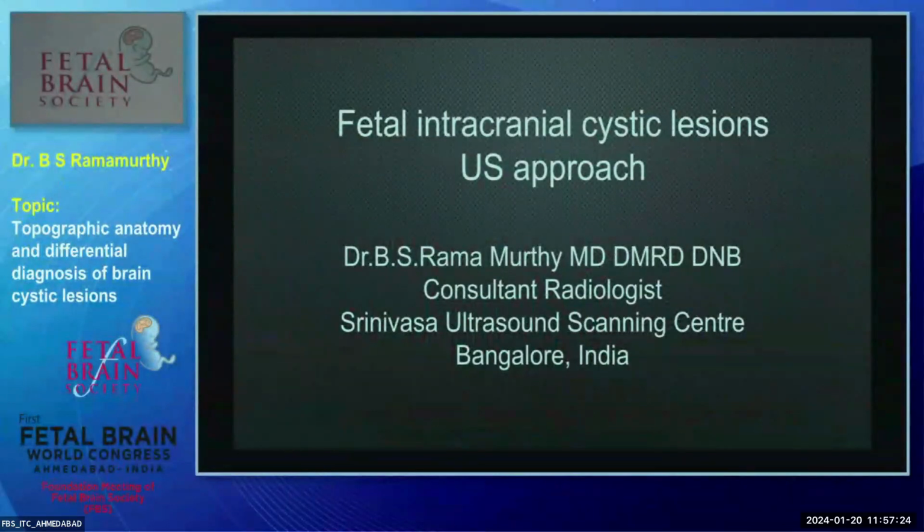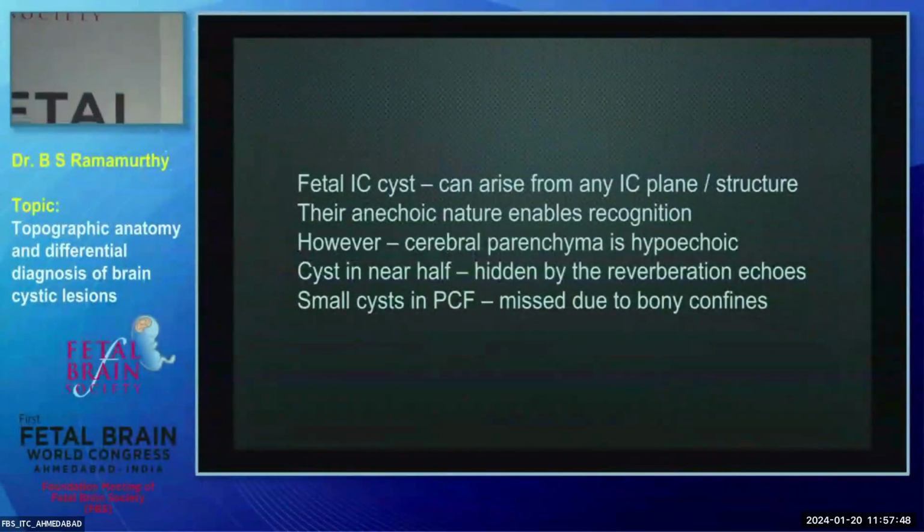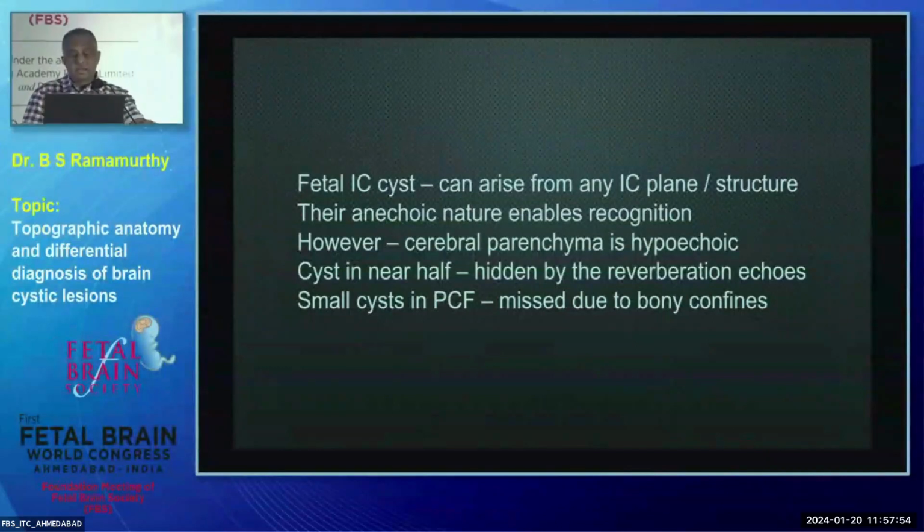Very good morning. In 20 minutes we have to look at the spectrum of intracranial cystic lesions. A fetal intracranial cyst can occur from any intracranial plane or structure. Their anechoic nature actually helps recognition. However, we must realize that the cerebral parenchyma also is intensely hypoechoic, so differentiating a hypoechoic cerebral parenchyma from a cyst may be challenging.